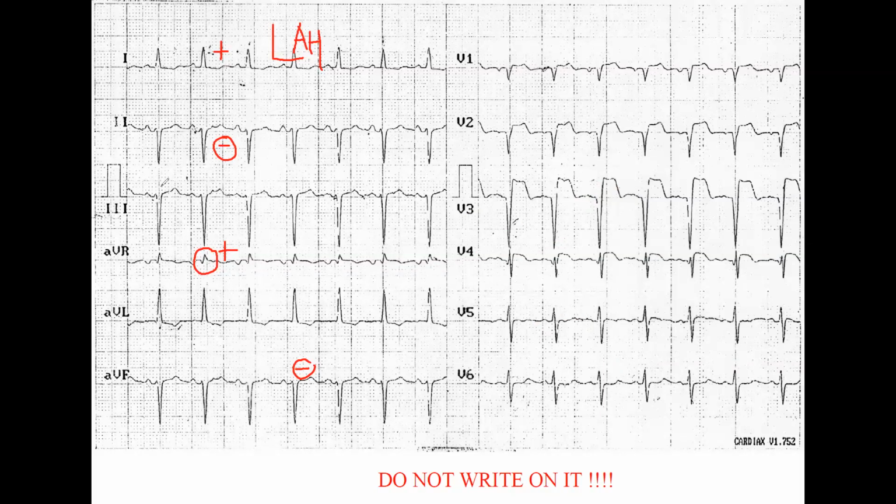Next, should we look for pathological Q waves first? Go for the pathological Q wave. You can go for lead 1. It doesn't have any. Lead 2 also not. Lead 3, no, because it's starting with the initial R. Nothing. AVF, no. Then ST elevation, no. You only finish with the limb leads. You can go for the chest leads.